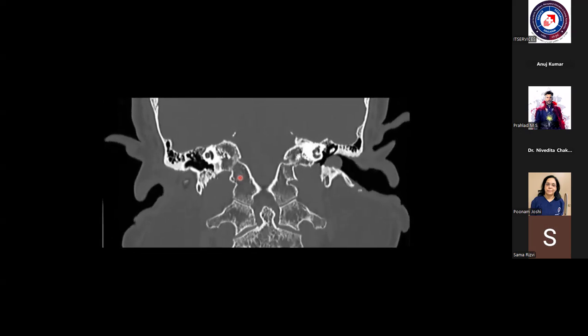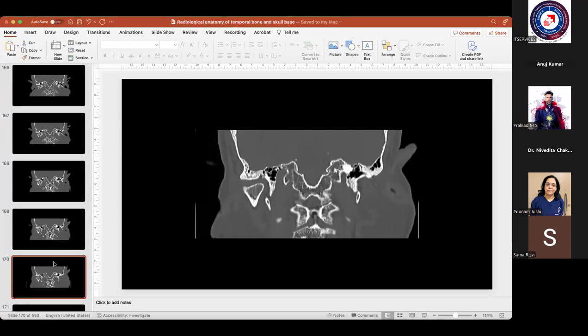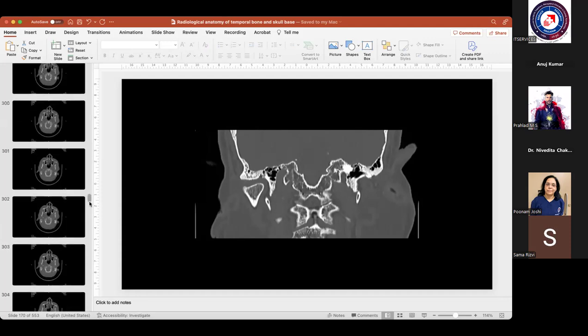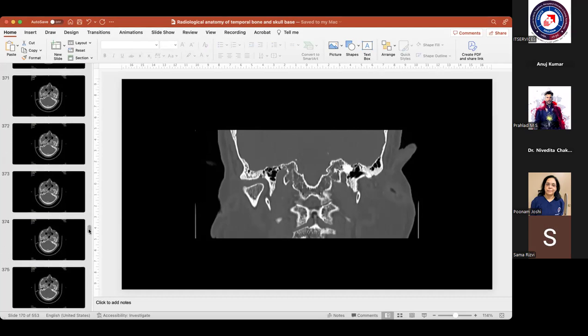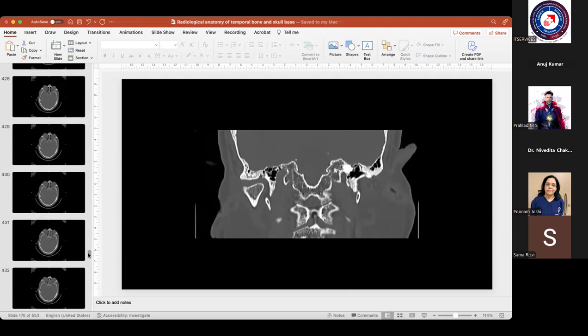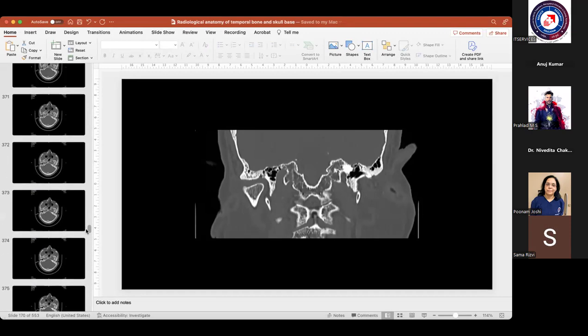I agree with you. Nivedita, can you please show the hypoglossal canal, jugular foramen, and its crest once again? Sure. That's why I said we'll be asking you again and again to show. That's why I have kept it only imaging based, with images I've collected, because the theory part everybody can read up. It is identifying the structures on imaging which is essential.